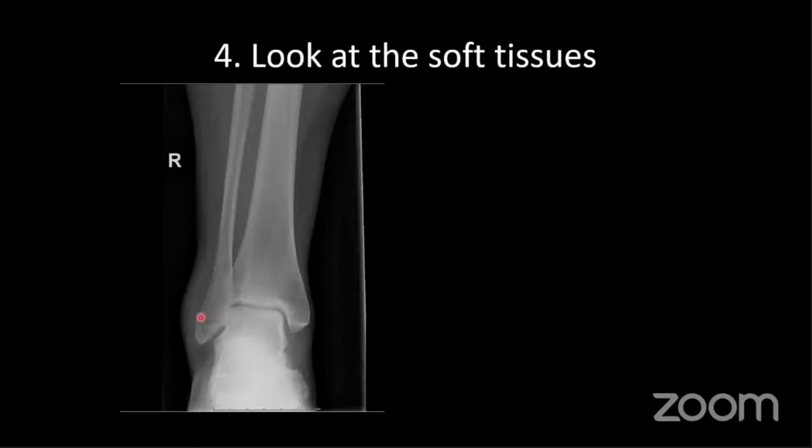But the thing I wanted to draw your attention to for this example is, if you look at your own ankle and you palpate the lateral and medial malleolus, there's very little soft tissue there. It will feel like this side here. That's a normal amount of soft tissue to have for most people. Obviously, some people have fatter ankles than other people, but the way you can tell whether it's abnormal or not is to compare to the other side. This soft tissue is clearly swollen.